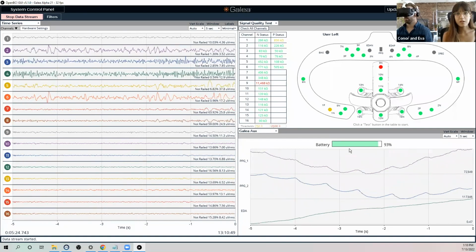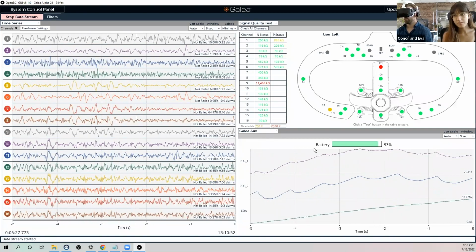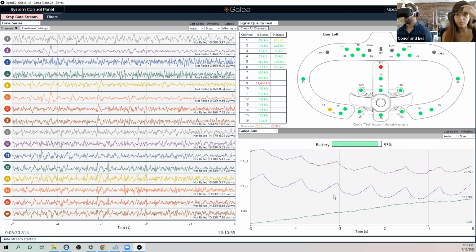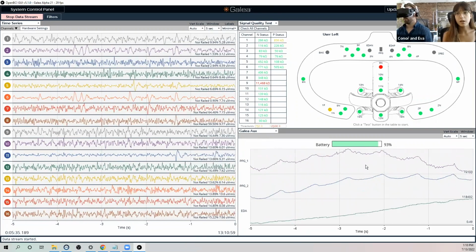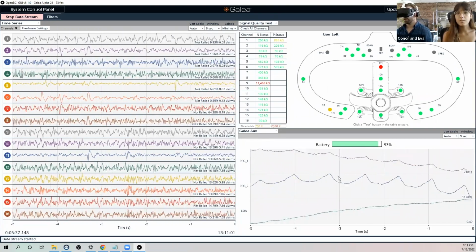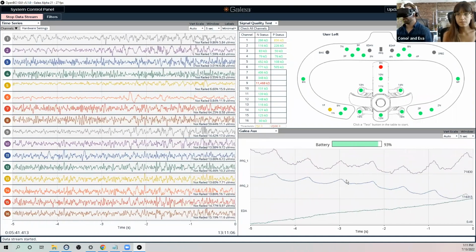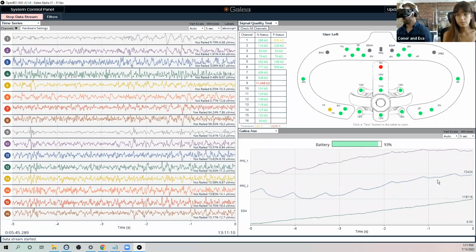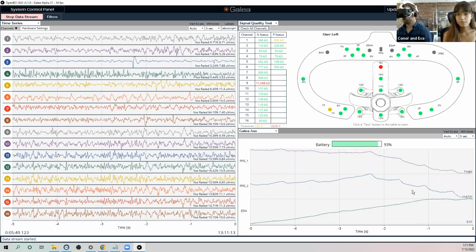So let's start with the auxiliary data. The auxiliary widget shows Conor's heart rate. So right now it's looking really good. It's getting the heart rate from his forehead. And you can see it in the first 2 lines. Yeah, so at each of these peaks, that's my heart beating. Occasionally, especially when I'm a little nervous, I get a little bit of a murmur here. You can actually see sometimes my heart will kind of skip a beat.